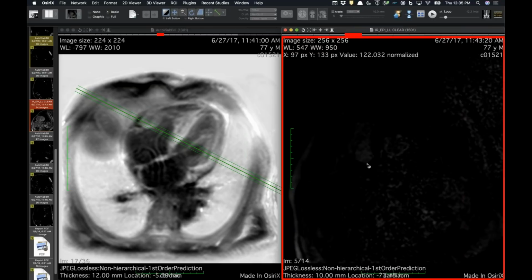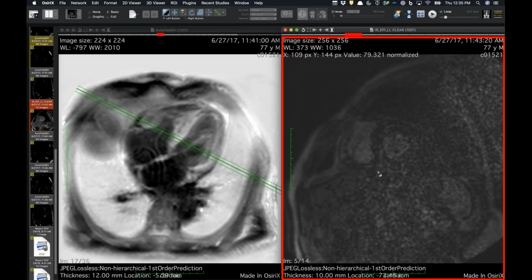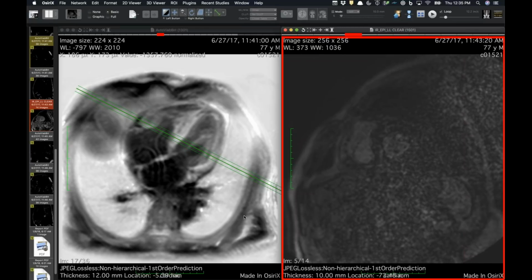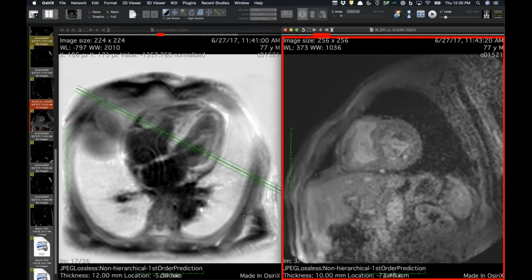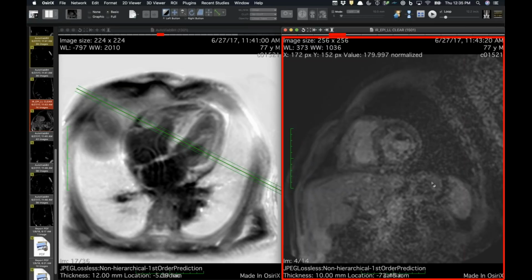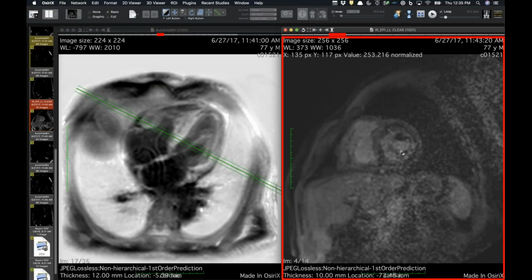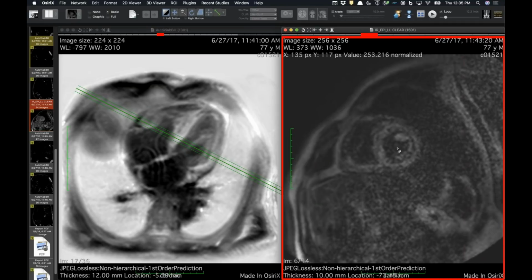I find it to be very, very helpful. It definitely makes the diagnosis, but I've seen subtle, early cases that are not as severe yet, so it doesn't happen. But if it's there, it's almost diagnostic. Yeah, this is a good example because you can see the myocardium is nulled between here and here, and then the blood pool nulls after that, so you can already see it's the myocardium.